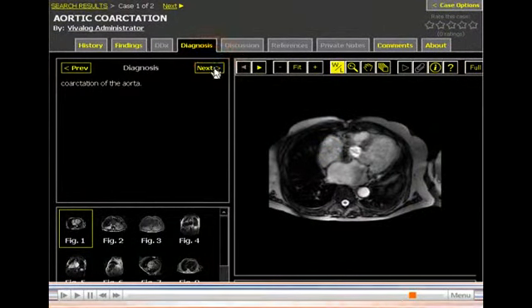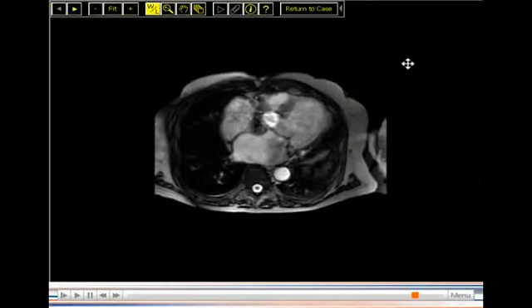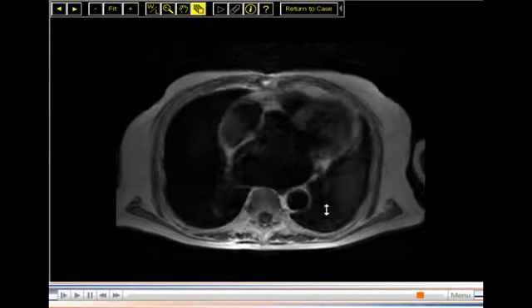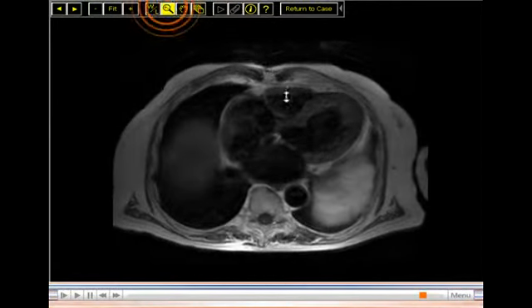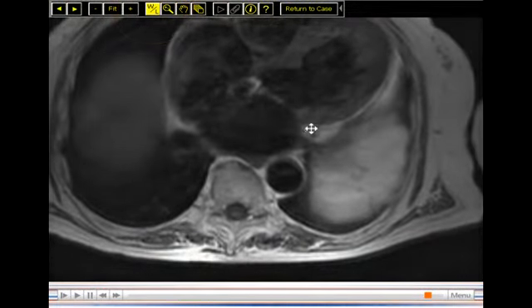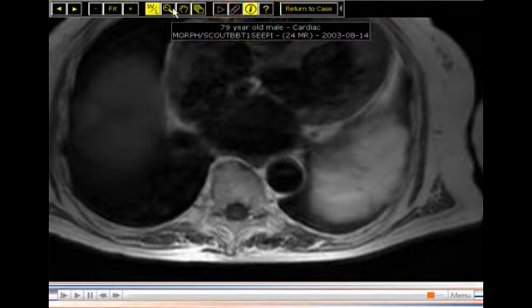Step through the case text tabs, view the key images in full screen mode, view the DICOM series, scroll up and down just like in the PACS, zoom in, pan around, adjust the window width and levels. All this with nothing to install.